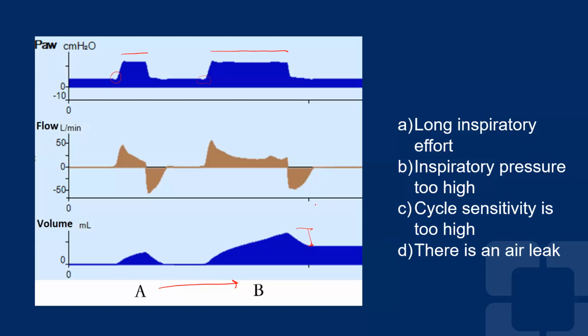However, most ventilators now have a safety feature for these kinds of situations, especially in non-invasive ventilation, in which you set a maximum inspiratory time. That means that if you reach the threshold for time, it will shut off the breath so that you don't continue to inflate the patient forever.